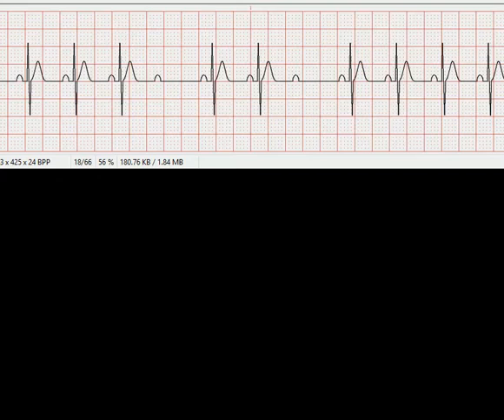Okay, so this one, QRS is narrow. I have P waves here. They're round, upright, symmetric. PR ratio, it's not 1-to-1. I've got more P waves than I have QRSs. How about the PR interval?